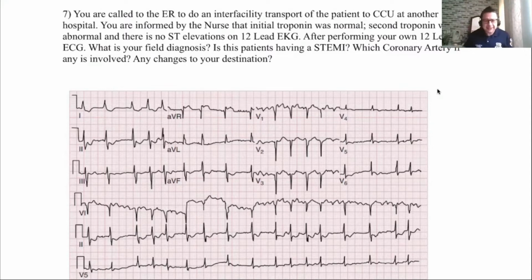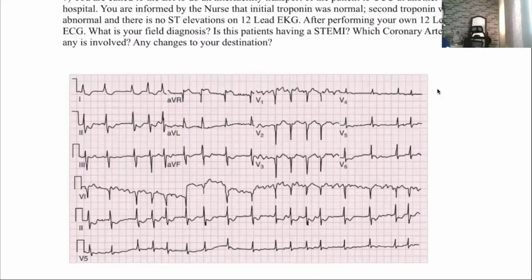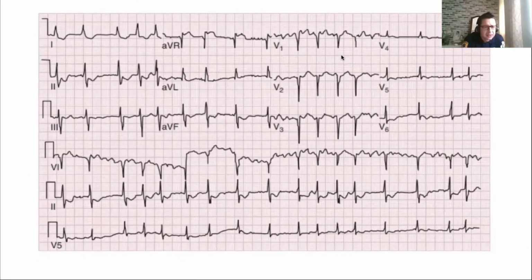Okay. This is, I had a call almost exactly like this. Okay, so there's the depression in lead 2. I'm sorry, my computer's going to die in 1 second. Lead 2 has a depression. Okay.